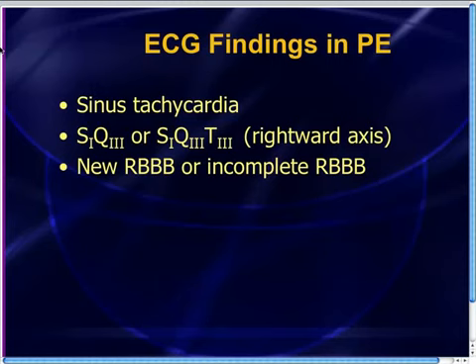T-wave inversions in the inferior plus anteroseptal leads together, when they occur simultaneously, that's highly specific for pulmonary embolism. This was something that was first described by Marriott a number of years ago, and it's been published in other literature. It's starting to make its way into emergency medicine articles as well. And we actually talked about this on the video casts back in December, but there's a few cases that have come across my desk, including Dr. Williams' case, that made me want to just go over this once again.